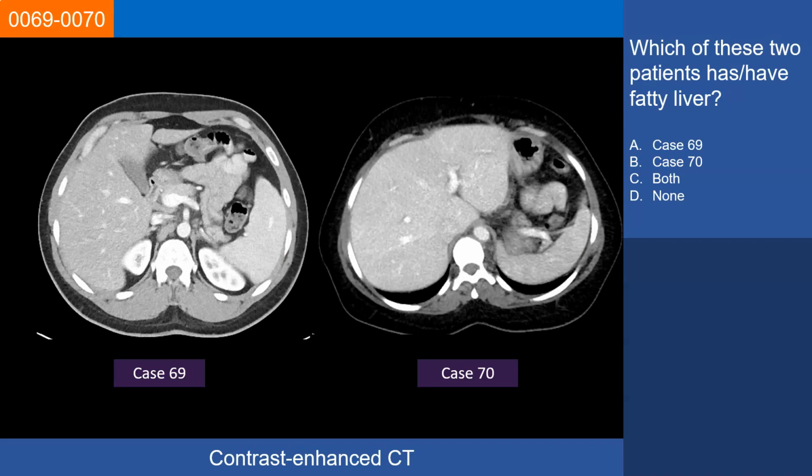Cases 69 and 70. These are 2 different patients, and we are provided with contrast-enhanced CT, and it is sometimes a dilemma to diagnose fatty liver in the contrast-enhanced CT if we are not provided with the unenhanced images. Some radiologists will go directly to say that we cannot diagnose fatty liver in the contrast-enhanced CT, but let us look at some of the helpful signs to make this diagnosis.